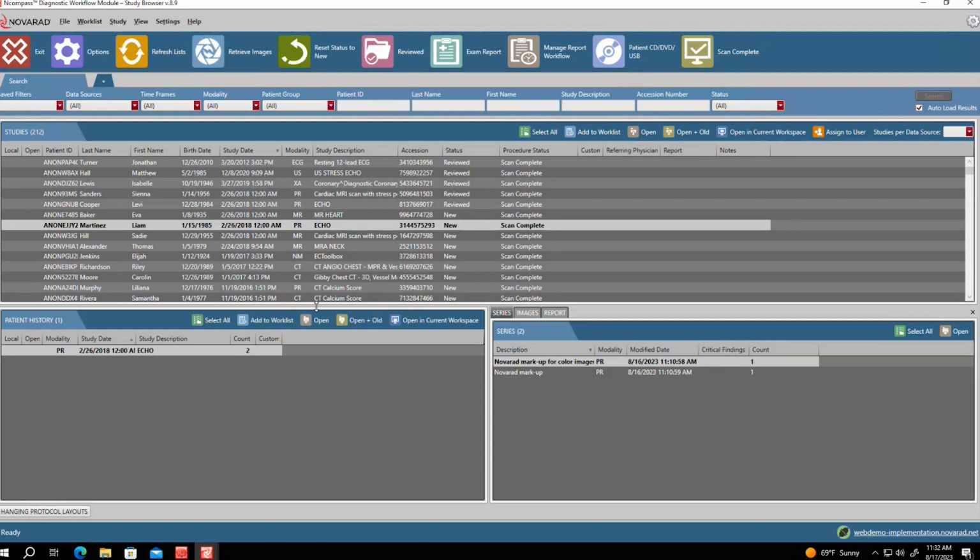You can move things around to mimic previous workflows or edit things so that it fits best for you and the way you're working, and each of your users can do that as well. All of their preferences are saved specifically to them, so making a change on their profile isn't going to affect anybody else. They can add different buttons or remove buttons or add different columns, and none of that's going to change for any of the other users.